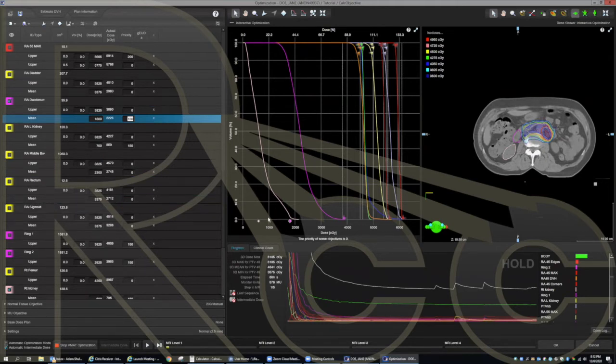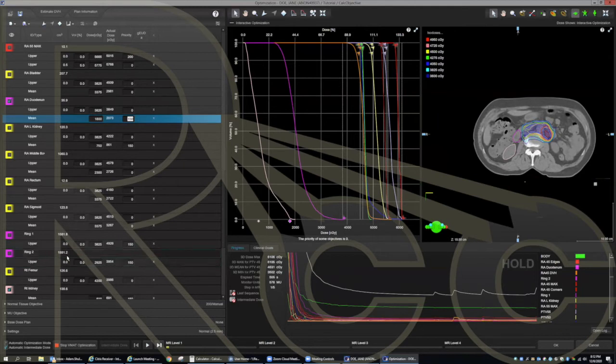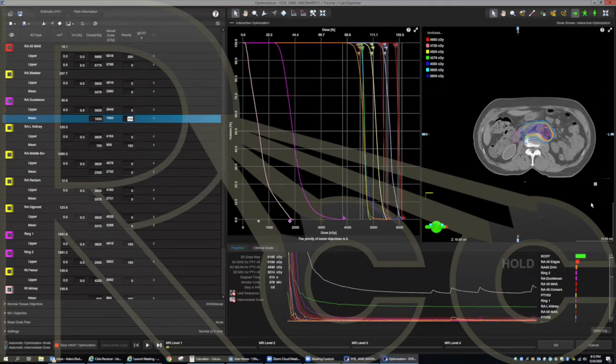And you're just playing with the mean dose. You don't do anything with the uppers, or maybe? Yep. I just play on mean right now because I only have 7 beam angles right now. Yeah, I'm not going to worry too much about this maximum here. Yeah, I'm going to struggle a little bit.